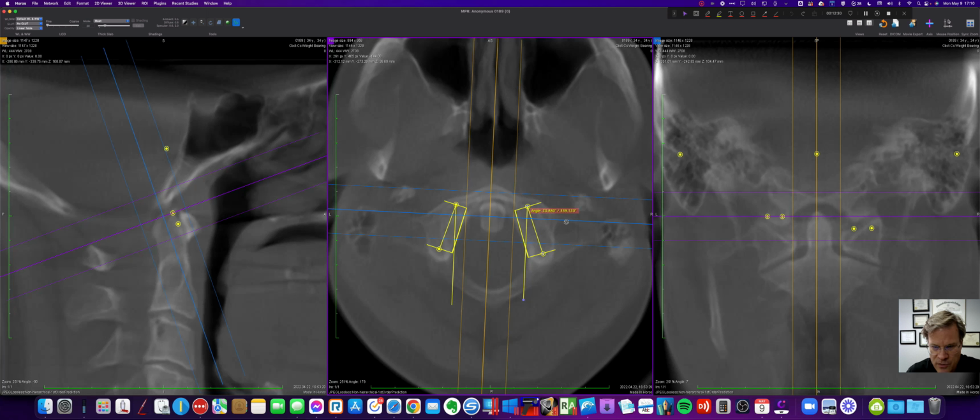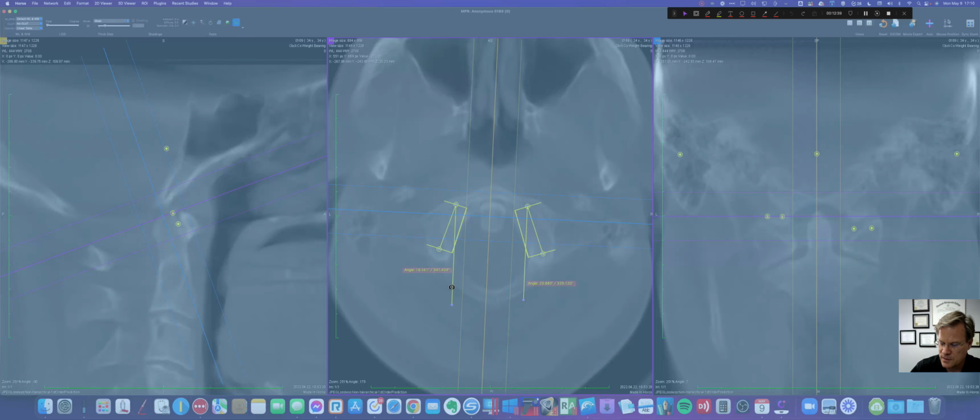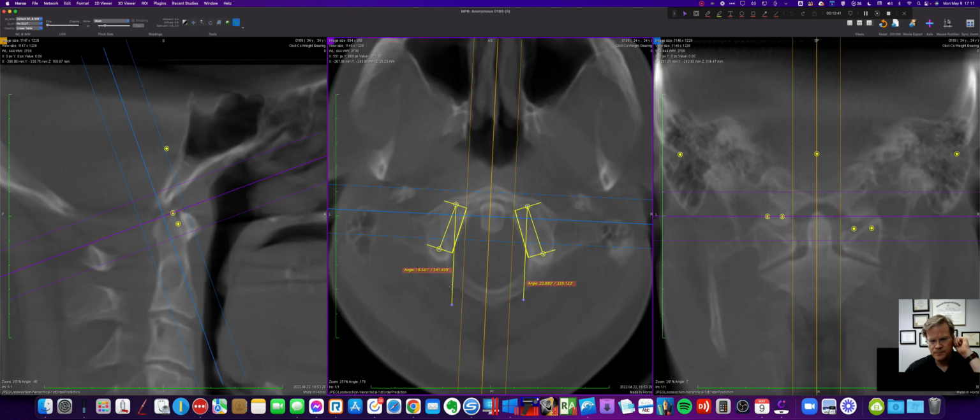All right. Convergence angle, basically 21 degrees. Now I'm going to hit Shift and select both and take a screenshot of that. Okay. Now, we want to measure the convexity angles, but we want to measure the convexity angles and the slope angles in this case to the ground.